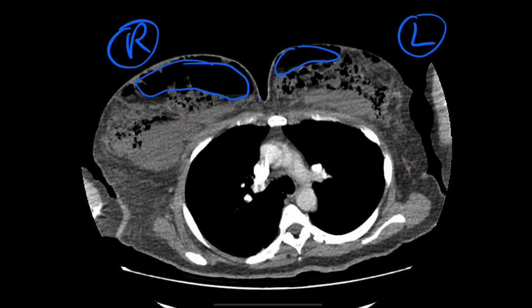Not right. That is grossly abnormal, and it indicates a severe soft tissue infection of both breasts. That's unusual, but can be very severe and very dangerous for the patient. So it indicates a severe tissue infection and would be typical of necrotizing fasciitis, things like that. Okay. That's the kind of anomaly I wanted to finish with, just to keep our audience thinking and looking forward to our next series.